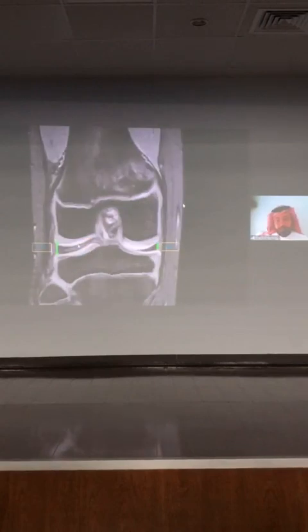Again, I teach my residents all the time, a radiologist with a ruler is a radiologist in trouble. Don't just go by the numbers, you go by the clinical judgment as well. So again, if it is like here, it does definitely look like a lateral discoid meniscus, even morphologically, even by eyeballing. You don't need the measurements. We use the measurements in equivocal cases. If we are not 100% sure, we go back to the numbers.